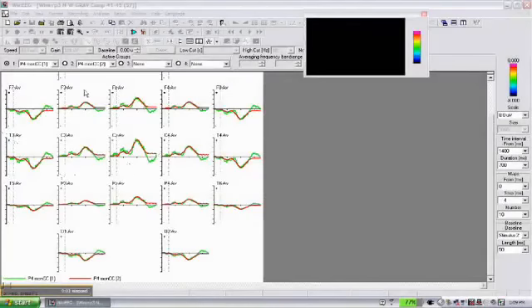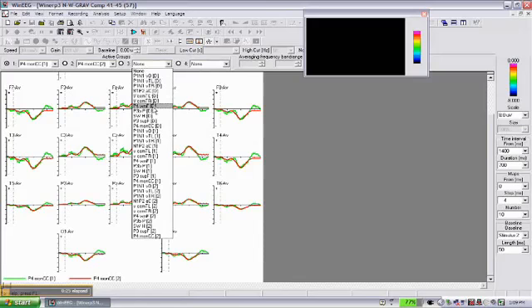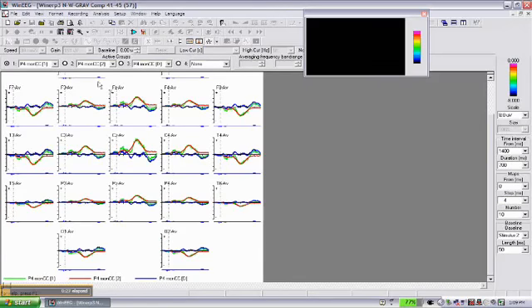Okay, so we can compare the monitoring component that is generated in the subgenual area of the cortex in this patient, green. And we compare it with the grand average monitoring component of the healthy subject, and as you can see there is no deviation from normality, so quite normal monitoring component.